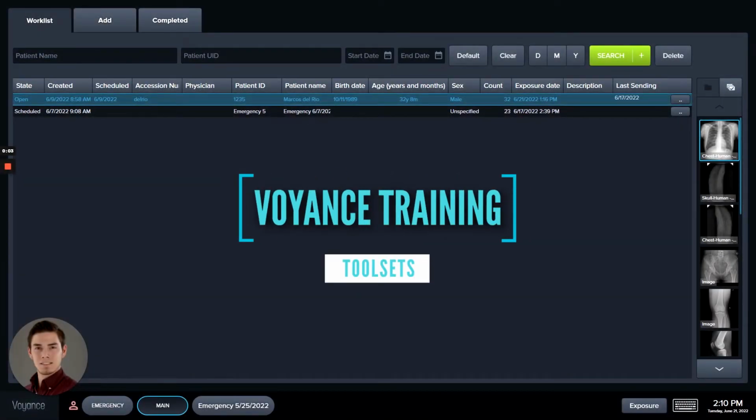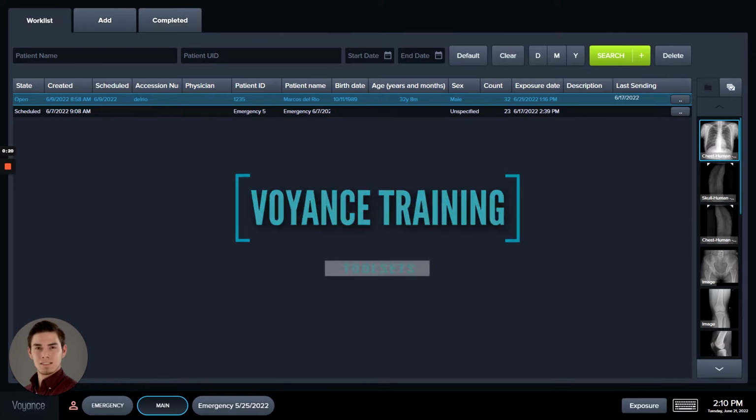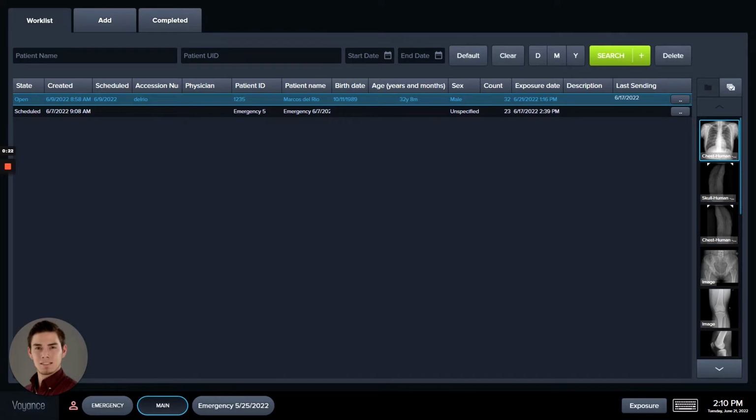Today we're going to be going over some of the tools that come with the Voyance acquisition and Voyance viewer software. Now we're going to be going over all the way from the basic tools, the image editing tools, some keyboard shortcuts, all the way to some advanced tool sets that chiropractors use, some specialized things here and there.